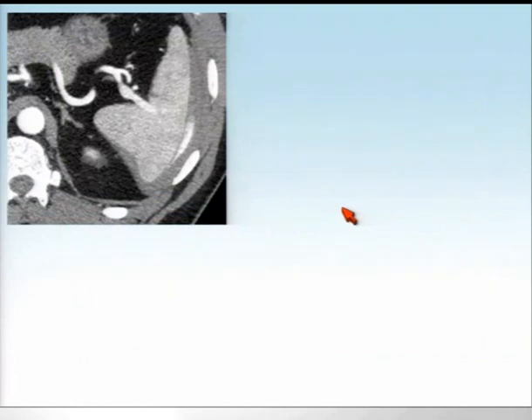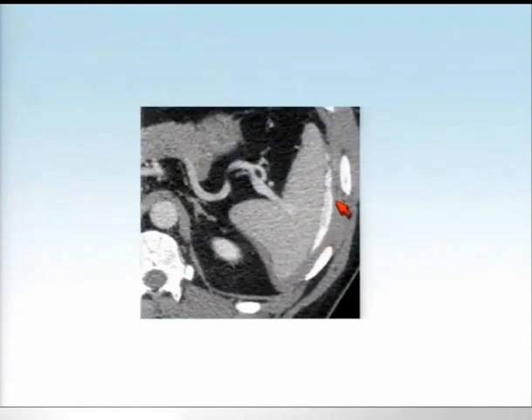If we think about the other major injury of the spleen, active hemorrhage, or arterial hemorrhage in this case, we see on the arterial phase active extravasation of contrast, which on the portal venous phase, as expected, continues to enlarge, and yet again, continued enlargement on the delayed phase. As far as any added value in active hemorrhage, there doesn't seem to be any. So we're really talking about contained vascular injuries of the spleen.